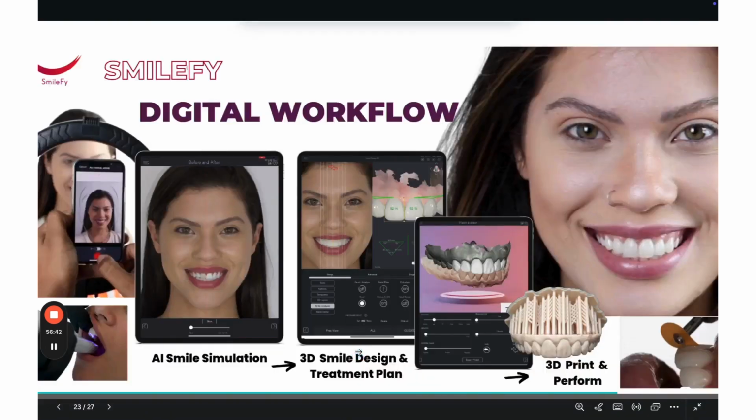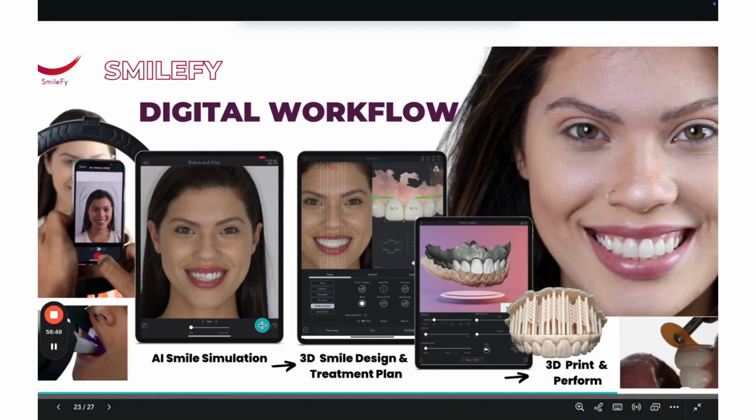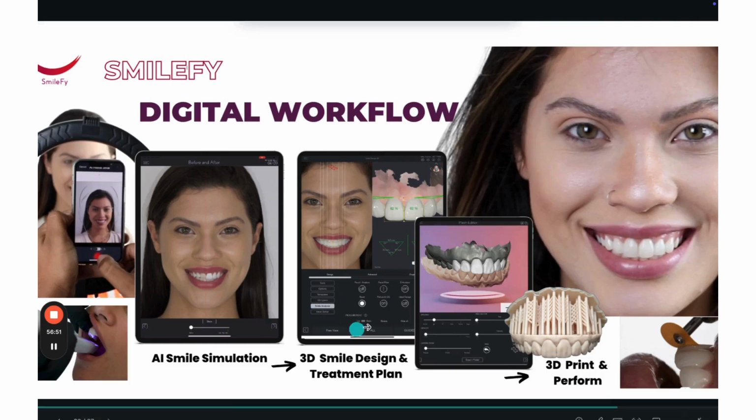Here is the entire workflow from A to Z. We started the first week with the smile simulation, and then we transitioned to our 3D mock-up design, and then based on the patient's feedback, exported as the final for the lab to be used later on.